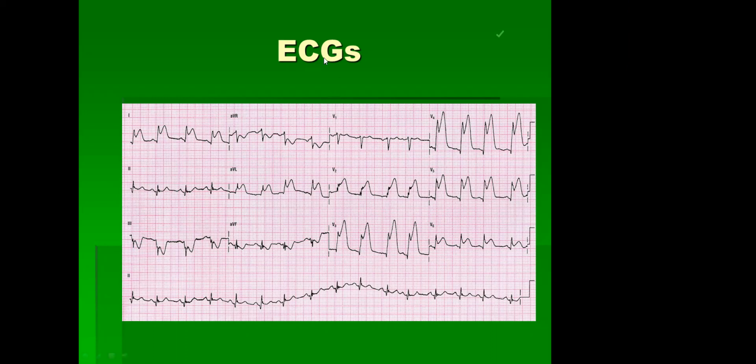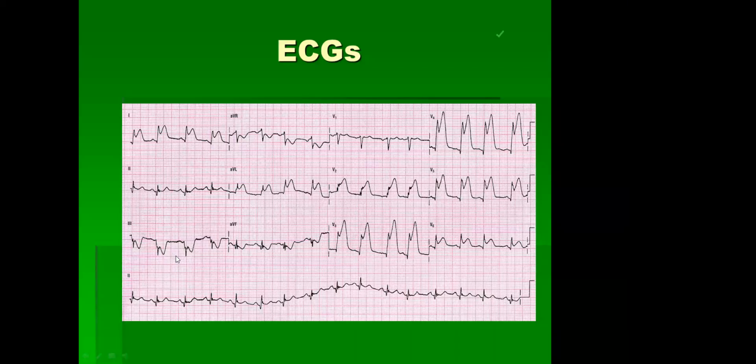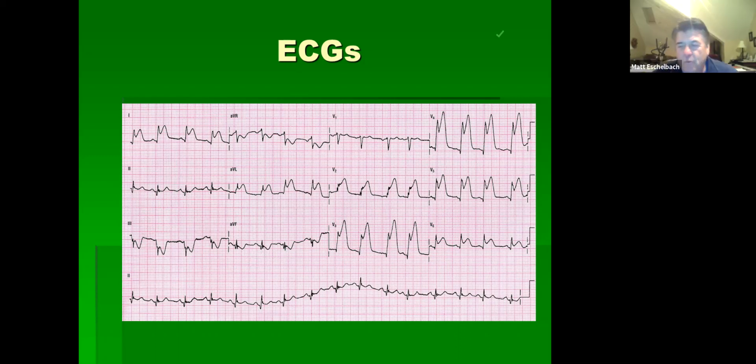2 looks pretty normal. Absolutely normal to me. You're right. 3 definitely looks like some ST depression, and then AVF, ST depression as well. All right, good. So remember that when we've got a reciprocal lead, meaning lateral with elevation, we have accompanying depression, so there's reciprocal changes. So now let's attack our other regions.